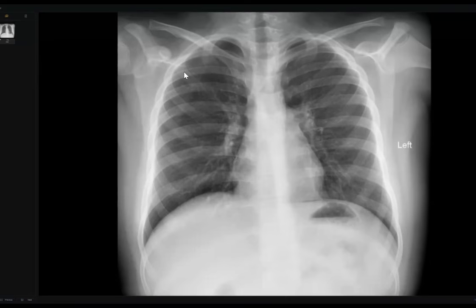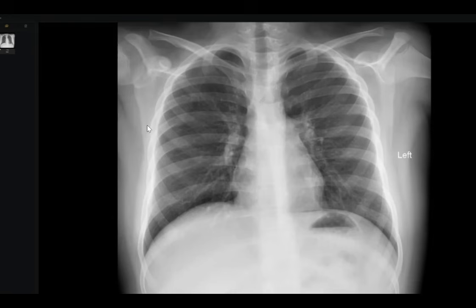Okay. So I would like to advise a lateral abdominal shoot-through to confirm my suspicion of pneumoperitoneum. Doctor, what is your next step? I'm waiting for the next step. CT. What else? CT abdomen. Before CT, I would like to change the window to confirm the findings, something more primary before the CT.